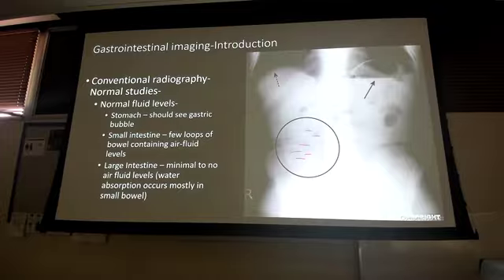which intestine do you think this is? Small bowel. I have a lot of little air fluid levels, but boy, it's right in where that ascending colon should be. It sure is, but I don't get air fluid levels in my large intestine. Okay? Minimal to no air fluid levels. So it's upright, I got air fluid levels. That's small intestine. We've likely got large intestine right here. I don't really see air fluid levels there. It's kind of pretty well circular in that aspect. But just to kind of give you an idea. What's this pointing to?